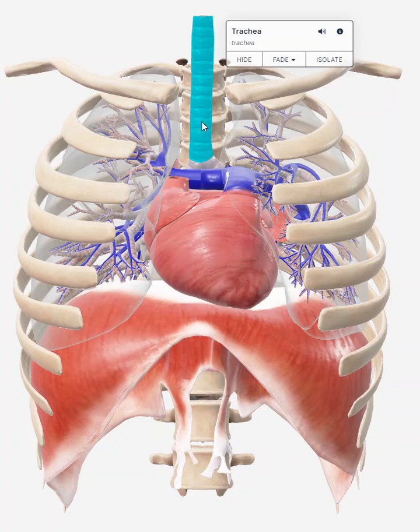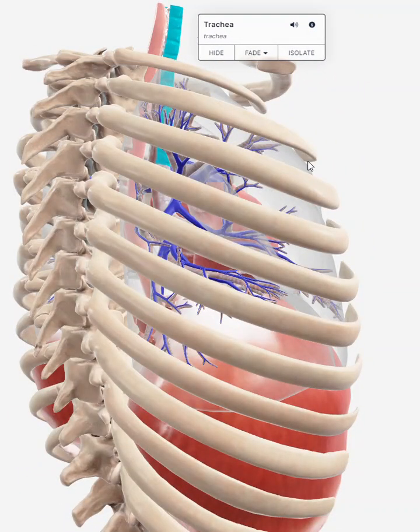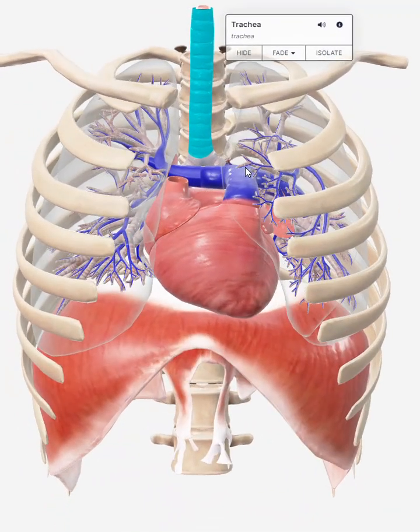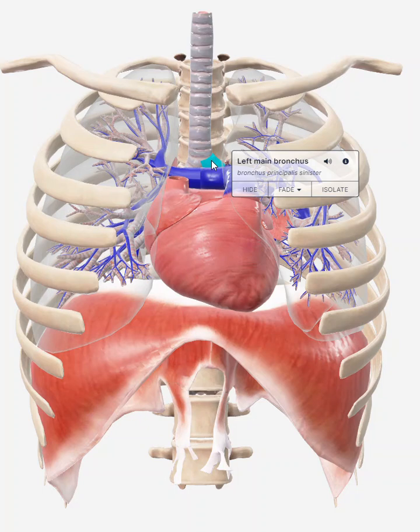Because the spine is behind the trachea, we will see the spinous processes superimposed through the trachea on our x-ray. So that's something that we'll be looking for. We'll see those spinous processes centered through the trachea. We'll also be able to see the shadow of the spine through the heart muscle too, because those structures are superimposed over each other.